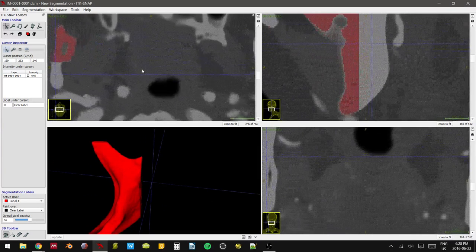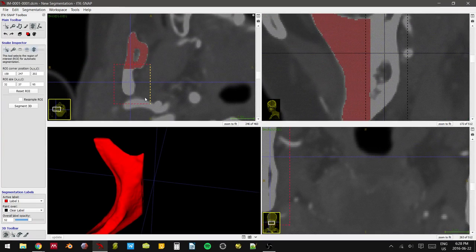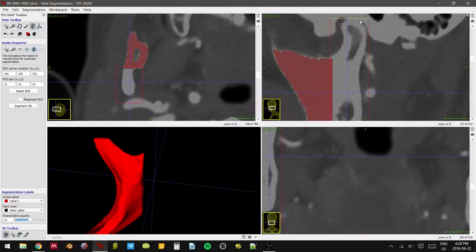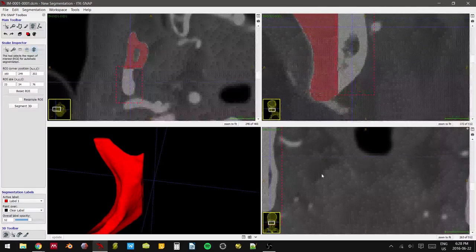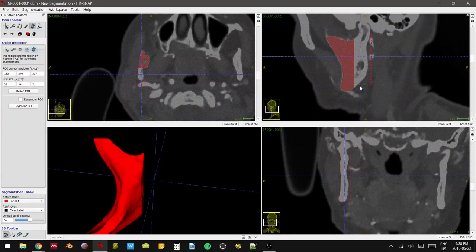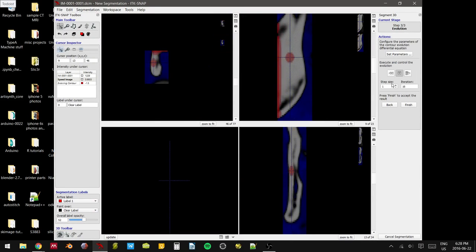So let's do the segmentation correctly. Again, target the region of interest. There we go, bounding box. And instead of going all the way up, we're going to stop here, right there, where there's a clear line of delineation. We're going to check all our axes. Pretty good. Okay, segment. Boundaries. Good. Next. Add the bubble. Next. Let it grow.